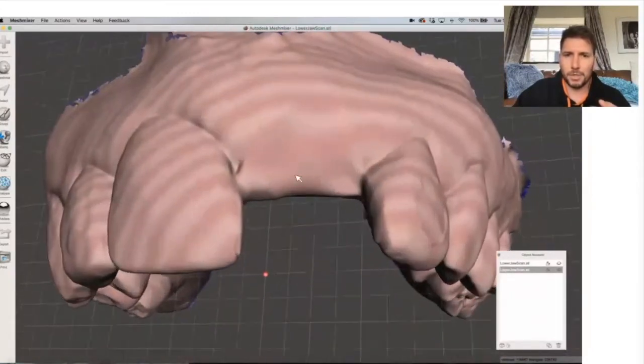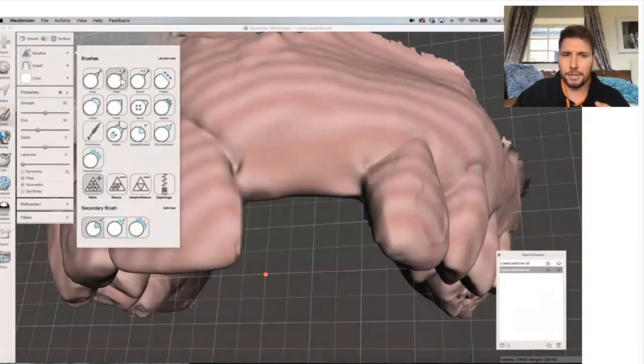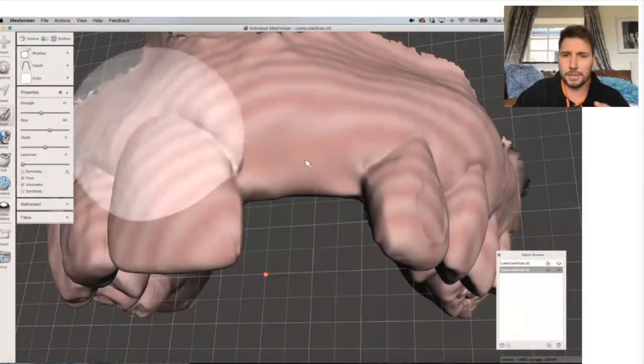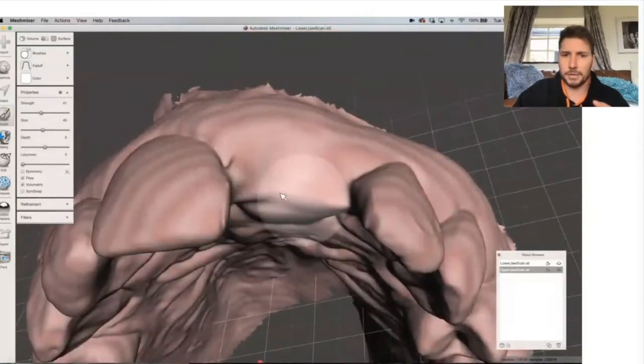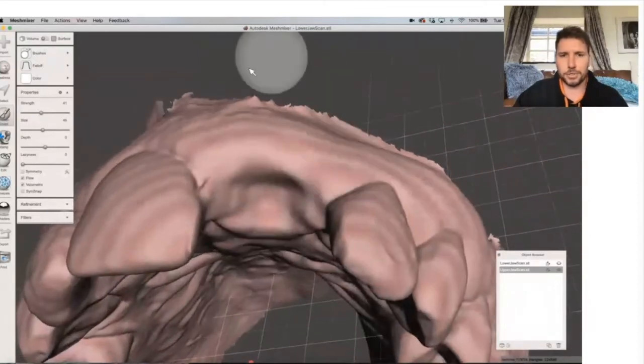So when I go back to sculpt and go on brushes, if I go on draw, and if I make a bigger brush size, maybe that's a bit too big, and strength there, if I draw that out, guess what it does? It does the opposite. So it pushes it in. So it makes life easy for us, okay? And sometimes you'll want to do that, all right? So you can ditch it in. Go, virtual extraction done, nice and easy.